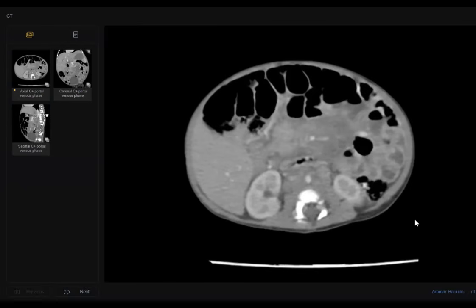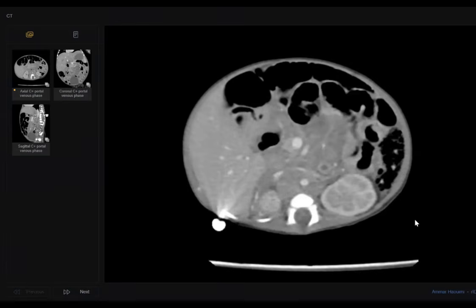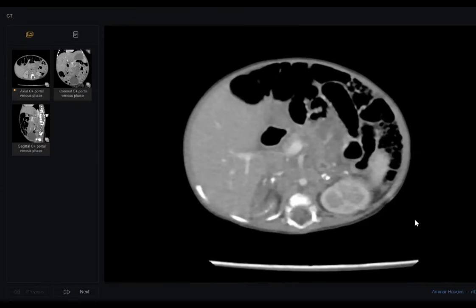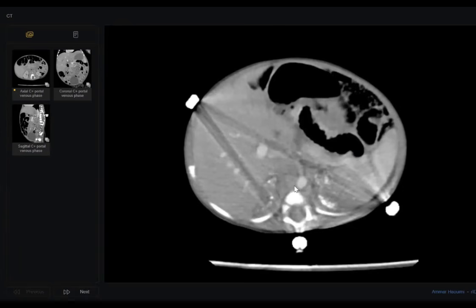Again, what is your area of concern? Where? Show me here. What is this? Show me by the cursor, please. Okay, this area is abnormal. These soft tissue lesions are abnormal. No, this is bowel. Use the mouse. Concentrate in this slice, please.